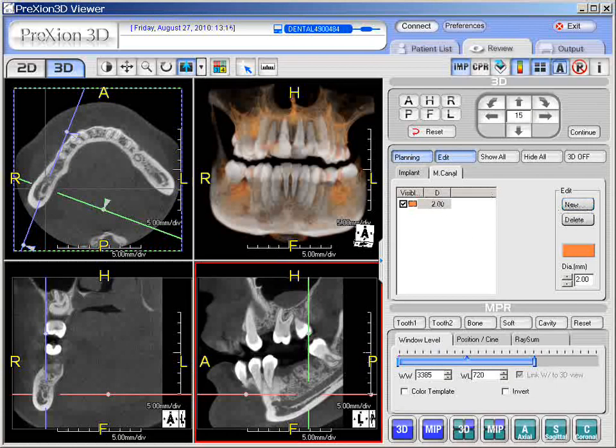Now, to actually start drawing the canal, we're going to bring our control key back in. Our control key is located on the lateral lower left side of the keyboard. Once we start clicking along the path from posterior to mental foramen, here's how it's going to be done. Left click it. I'd like to start the first green circle a little bit outside the posterior edge, and I'm going to space it approximately about 5 millimeters apart. I'm just going to left click along the path.